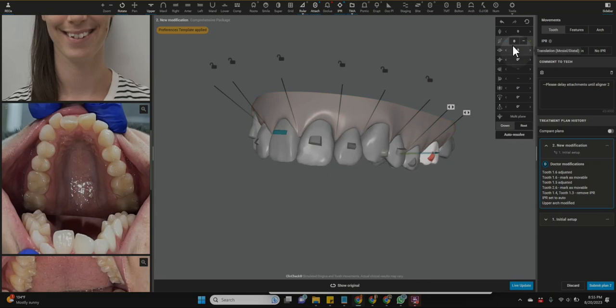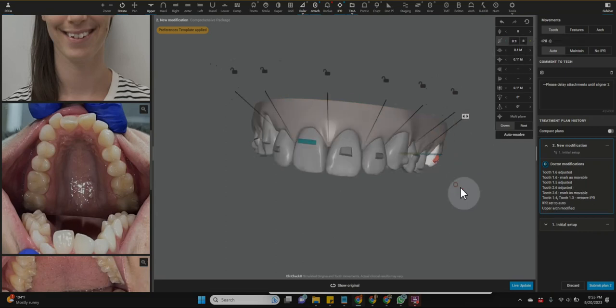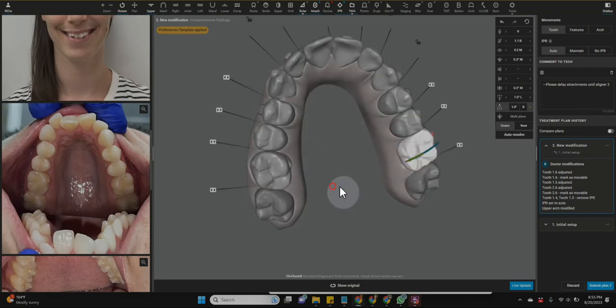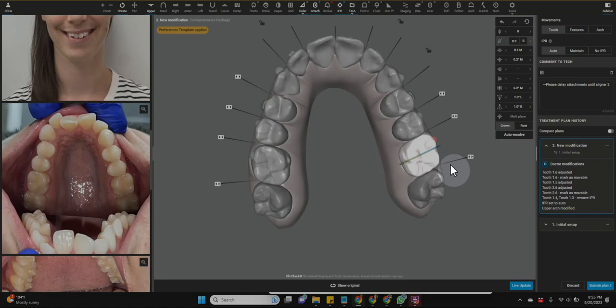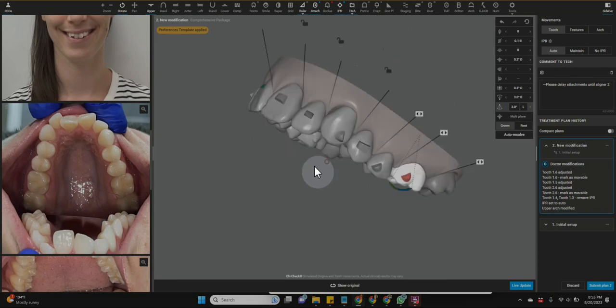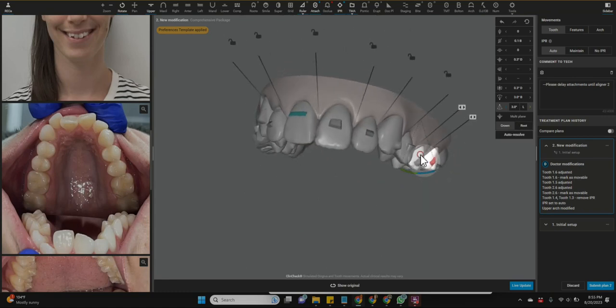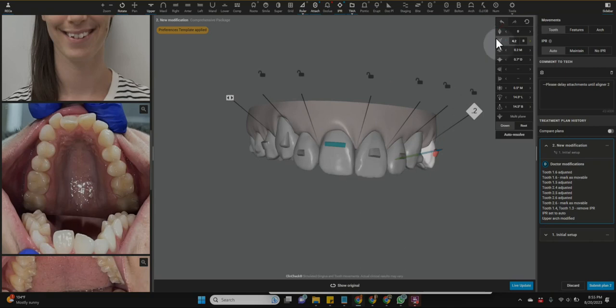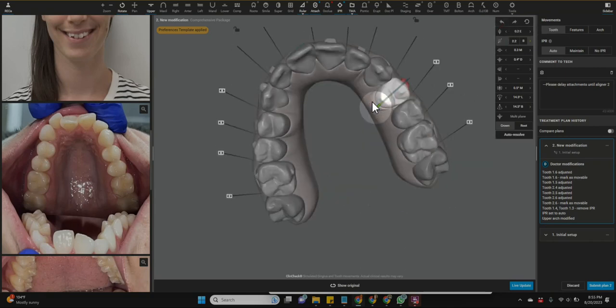I like to do the maxillary teeth visually until it looks like they are in a better arch form. So that looks reasonable to me as far as alignment with the second molars. And then I'm going to add some lingual crown tip, and this is just so that on the ClinCheck, clinically, we end up in a safe zone. We don't have to worry about that nearly as much with premolars because they are single-rooted teeth. Even the first premolars, they do have a palatal cusp, but it's not as long in bone or separated in bone as we would see with maxillary molars.